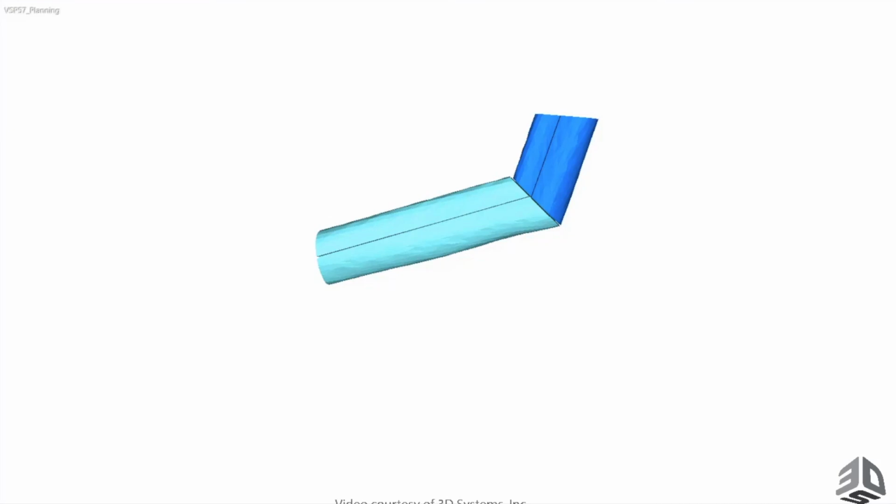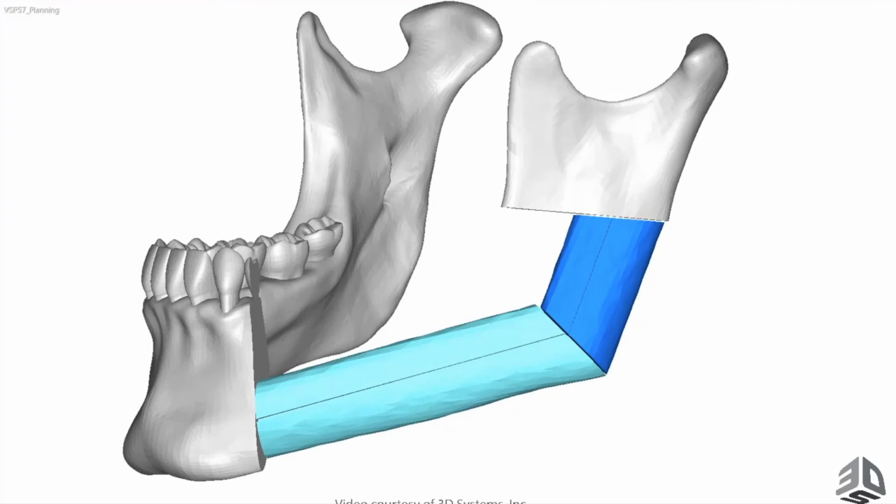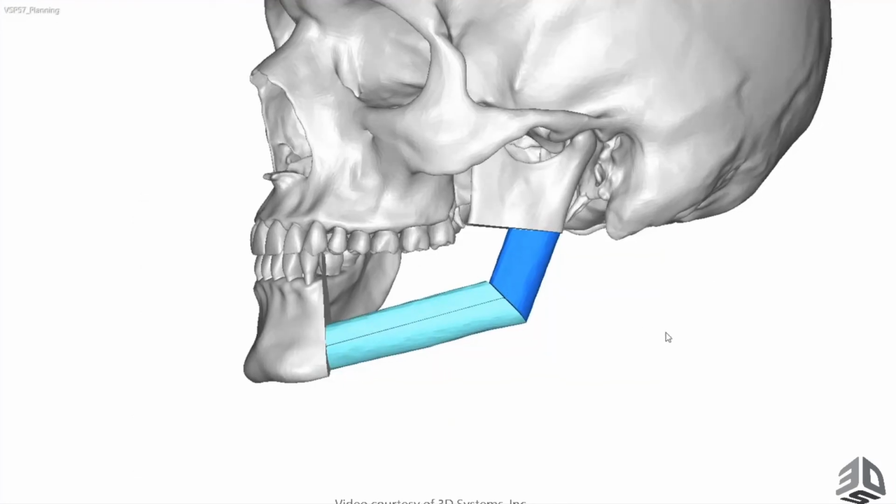Okay, perfect. What else can I help you with here? I think that's pretty much everything. So we've gone through the resection, the side, the margins, the guides, the plate designs. How quickly can you turn that around for me? The guides, we would say a 5 business day turnaround, 5 to 6, and then with Stryker's current protocols, that would be a 7 business day turnaround for the custom plate.